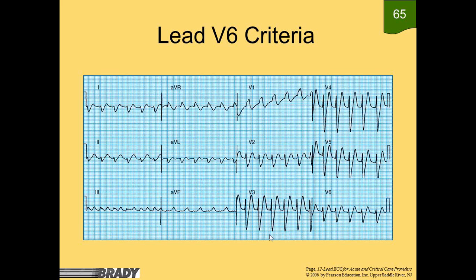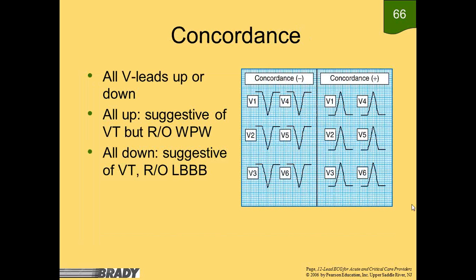So we're going to look over here at V6. You can see it is primarily down. Let's look at 1, 2, and 3. 1 is down, 2 is down, 3 is up, and V1 is up, and V6 is down.